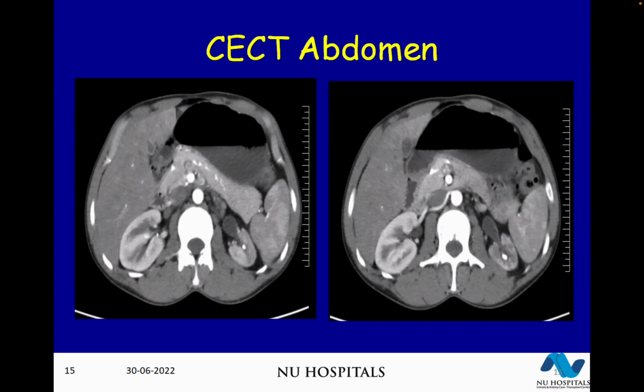But then this is clearly outside of the purview of the cortical surface of the kidney. It's well outside. So for all practical purposes, there is some serious pathology going on in this kidney, unless it was all stone and unless we have earlier x-rays. Prima facie, on the basis of this x-ray, I would take this kidney out.